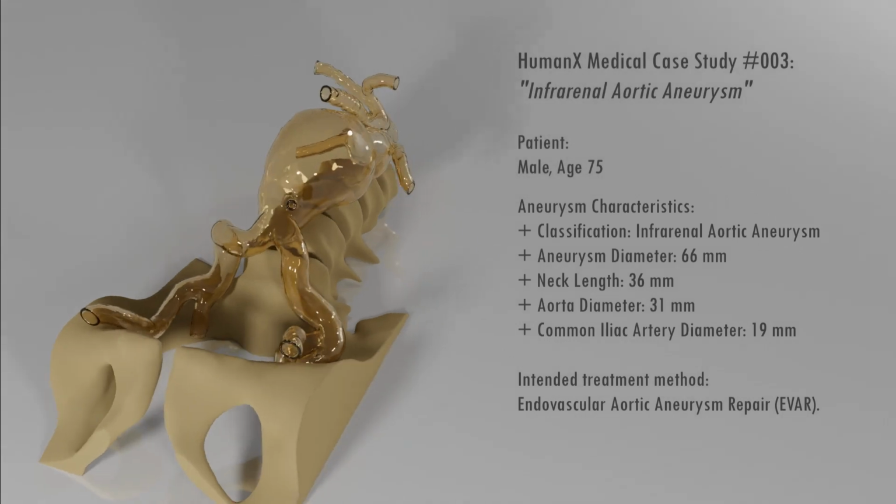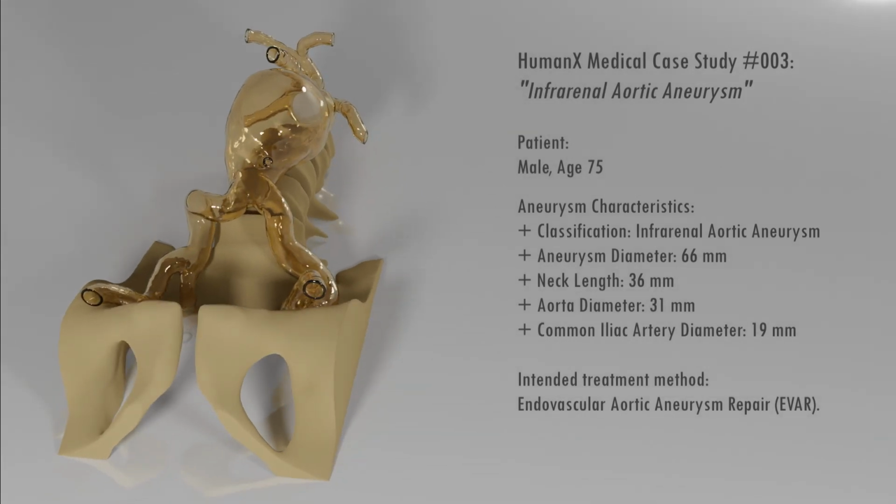One particular focus was the presentation of the right common iliac artery. This had a special shape that could influence the guidance of the catheter. We decided to design a two-part vascular model. The aortic aneurysm should be made of transparent acrylic material to allow a clear view into the vessel. The bony structures were to serve both as anatomical landmarks and as a secure stand for the acrylic model.